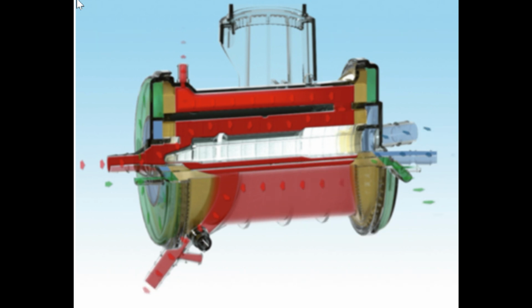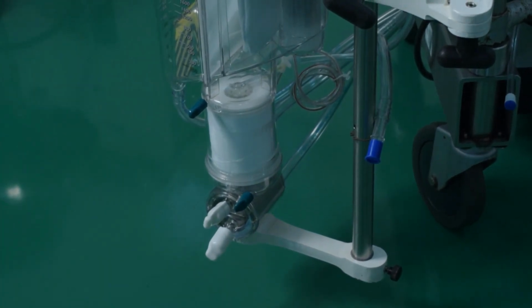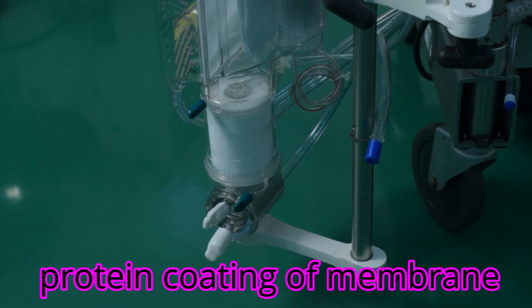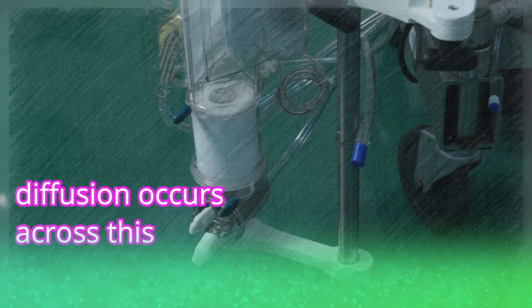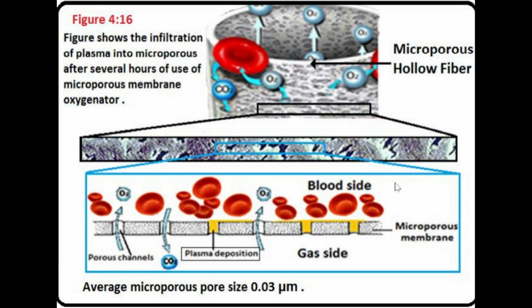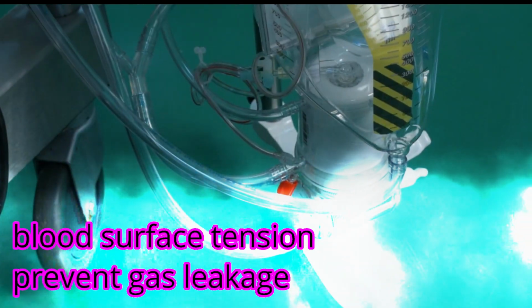Now gas and blood are partitioned into separate compartments with either a limited or absent blood-gas interface. The microporous membranes allow at least a transient direct blood-gas interface at the start of cardiopulmonary bypass. After a short period of time, protein coating of this membrane occurs and there is no further direct blood-gas contact. A thin layer of proteinaceous material covers this membrane and forms an area over which diffusion of gas happens. The micropores provide conduits through the polypropylene membrane that give sufficient diffusion capability for both oxygen and carbon dioxide exchange. Under normal circumstances, blood surface tension prevents gas leakage into the blood.